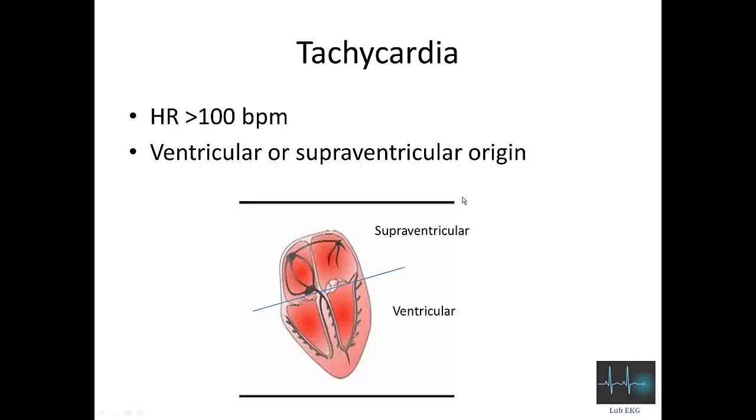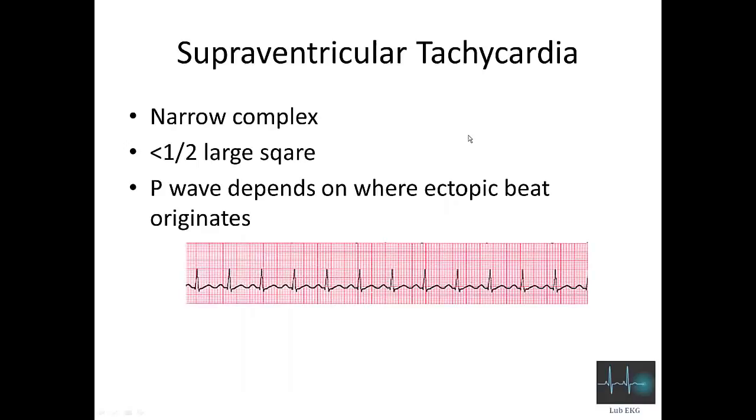Let's talk about tachycardia. Still divided into supraventricular and ventricular tachycardias. Tachycardia basically means that you have a heart rhythm which is more than 100 beats per minute. The supraventricular tachycardia, again applying the golden rule, tells us that we have thin QRS complexes. Okay, how do we know that this is a tachycardia? Well, we count between the RRs. So 300, 150. So about 150 beats per minute.